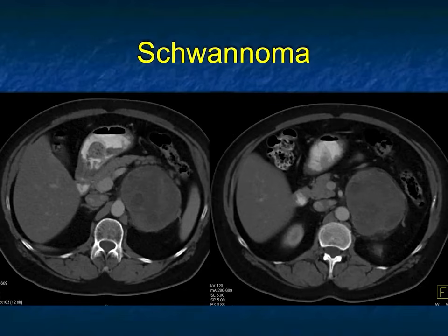And in this case, it was a schwannoma. Yes, I do agree it was adrenal, and I do agree it should be an adrenal cortical carcinoma. We've seen a handful of schwannomas. They're often small. They can be large, as in this case. We think about neurogenic tumors as low CT attenuation, and that could be helpful, but I have to admit here, I'm looking at this mass thinking it's simply necrosis.